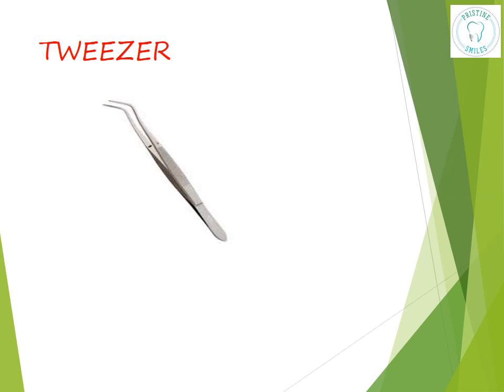In all, these are the 4 instruments, that is the mouth mirror, explorer, probe and tweezer, which are used as diagnostic instruments.